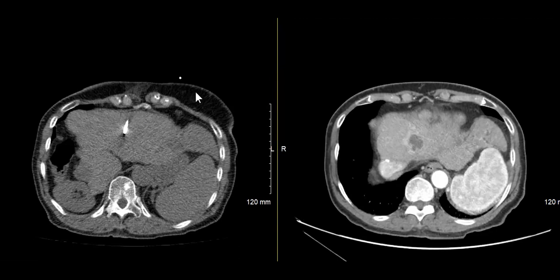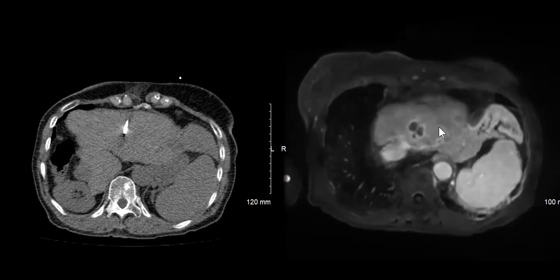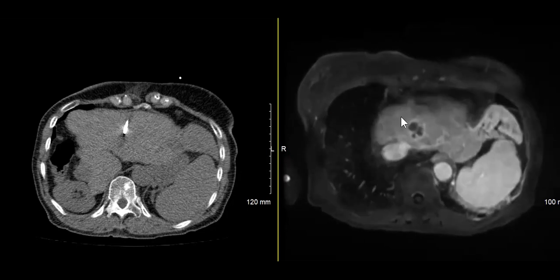So this is kind of insane because this patient now developed both path-proven intrahepatic cholangio, and about 9 years later came back with new HCC. Now, I don't know how much I trust the biopsy that this is a well-differentiated HCC. This has a very LRM appearance, which indicates quite aggressive biological behavior, so I wouldn't necessarily trust the well-differentiated part. It's possible that there are some biphenotypic components, so this is combined, but this wasn't resected at this point. This was biopsied, and then I believe she had ablation.